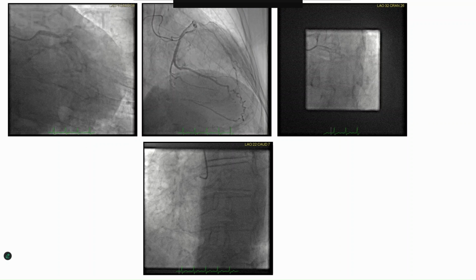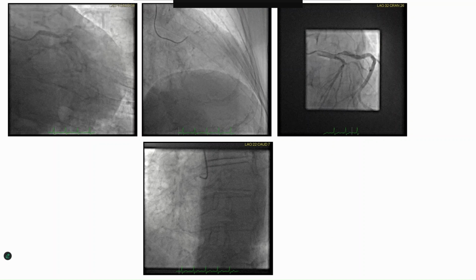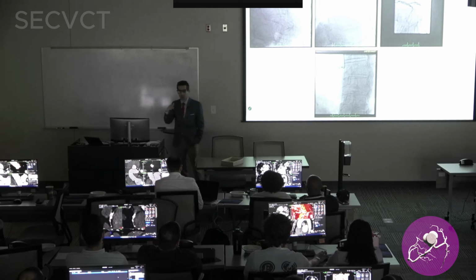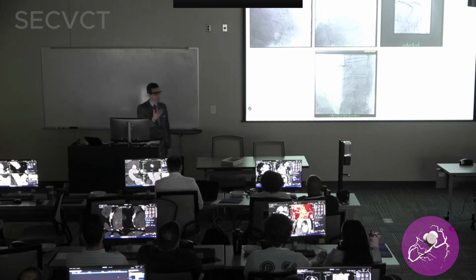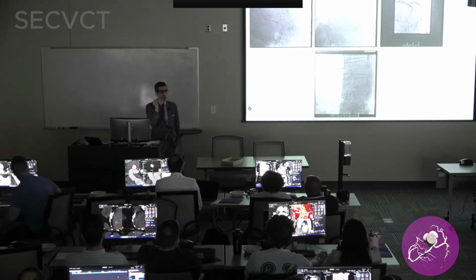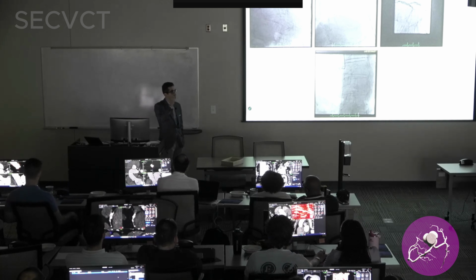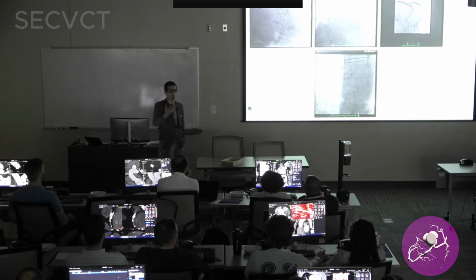However, I argue, especially with better machines, left main, proximal mid LAD, proximal mid RCA, and to some degree proximal circ should be part of your routine assessment. Think about it as a rule-out test, i.e., if you are able to say there's no obstructive disease in these segments, that's enough to reassure the operators that they do not need to perform a cath.